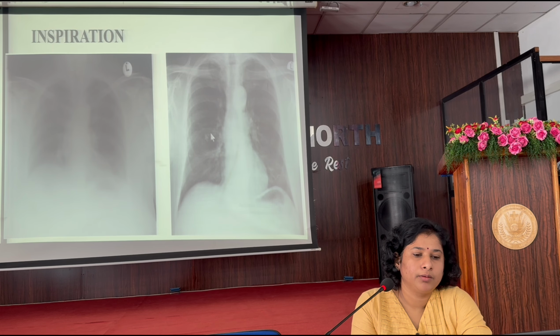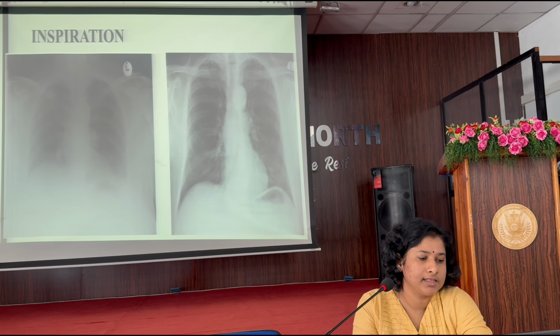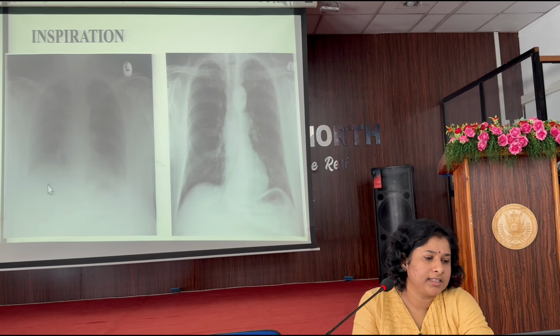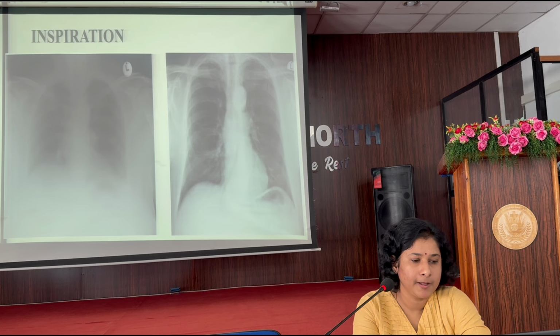In the second, both lung fields are black, that is, well aerated. But in the first image, the lungs are only vaguely seen. There's a total haziness, and it's suspicious for reticulation or consolidation in the lung bases. This can be overcome by taking the X-ray in a full inspiratory phase.